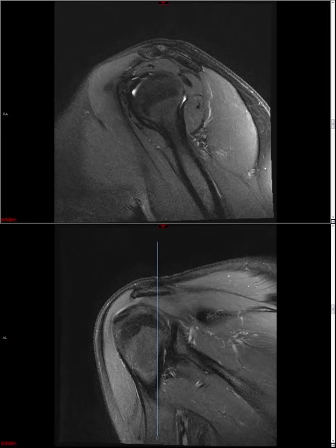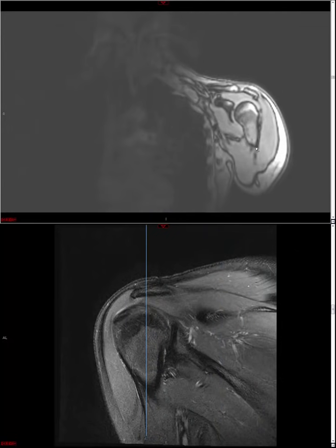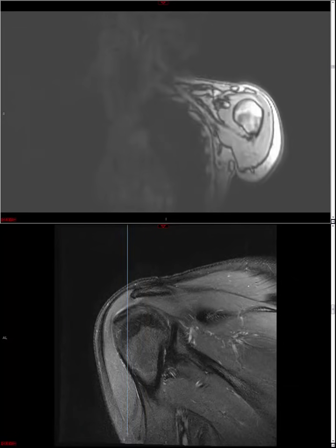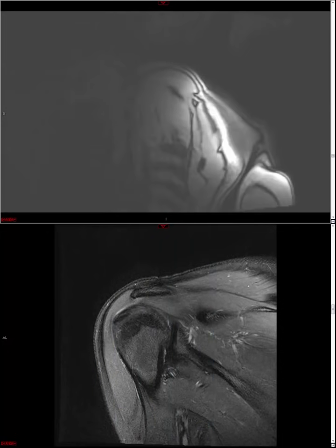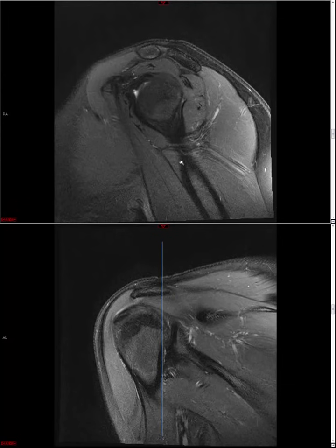And so we're going to begin actually with a comment about the localizer image. Unlike the knee, the localizer, which the tech does to ensure that the patient is positioned properly within the scanner, actually shows you a lot of anatomy that isn't shown on the subsequent diagnostic sequences. So it's important to at least spend a few seconds reviewing the localizer images and ensuring that there's not a huge lung cancer or a spine lesion or something like that hiding on the images that we would be responsible for reporting and alerting the clinicians about. Okay, so having dispensed with that, we get to the actual case itself.